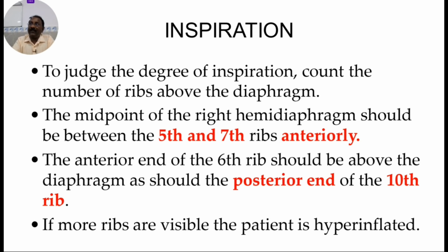Now inspiration, in RIPE. To judge the degree of inspiration, count the number of ribs above the diaphragm. This is very important, whether it is a good inspiratory film or an expiratory film. So here the ribs will help you. Counting the ribs will help you.